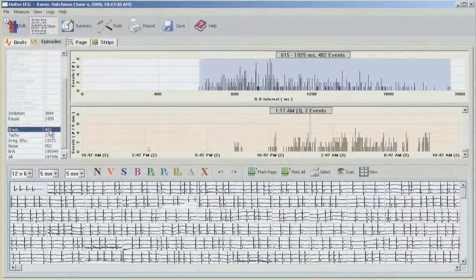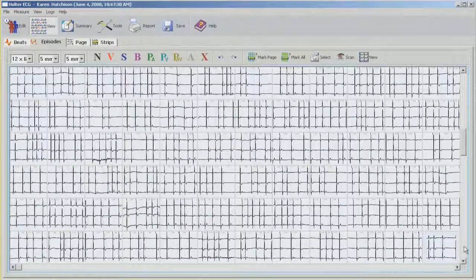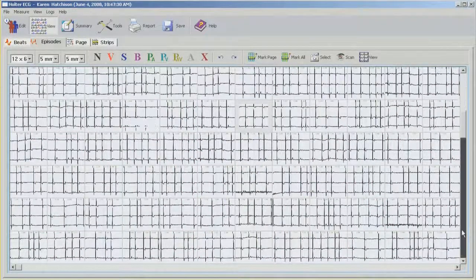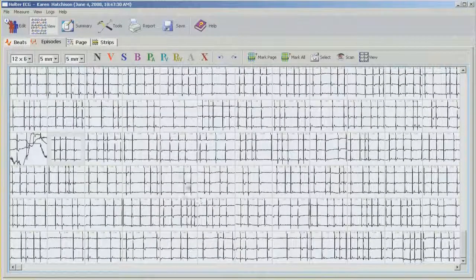which will make the study quite urgent to be reported. Moving on to bradycardia events. Again, just quickly going through to make sure there's nothing missing. If I want to look at something in full disclosure, again, just double click on any of the squares that you want to check. And this just seems to be slow.